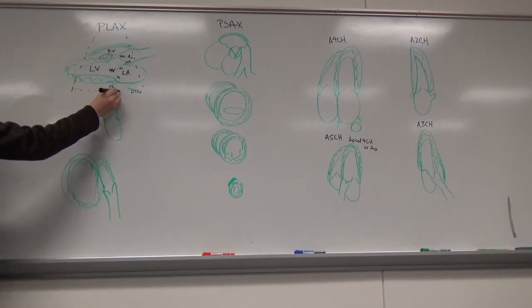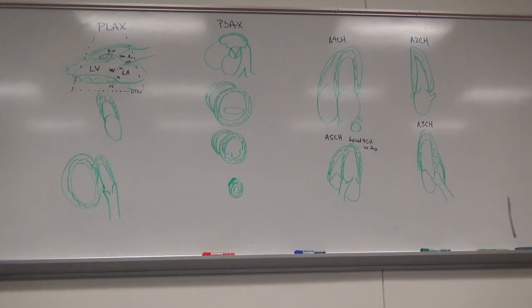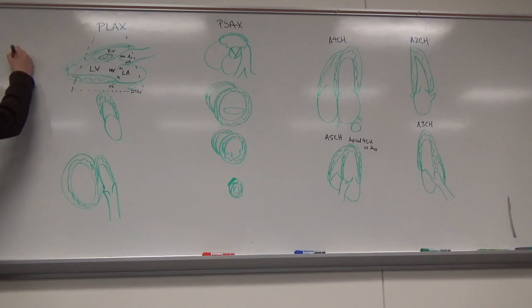I don't get as concerned about leaflets on the tricuspid valve or the pulmonary valve, but you definitely want to know the aortic valve and the mitral valve in all your views, and what leaflets we're seeing. In fact, on the mitral valve, we're going to get into the scallops of the leaflets, which is a segment of each leaflet, because that becomes important as we get into regurgitations and fixing the valve.